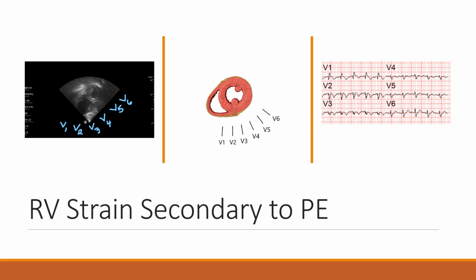And so you can see the left ventricle is definitely holding its shape. It's squeezing away, really, really compressing, and that's because it's not getting any blood. And it's not getting any blood because you can look at that right ventricle, and instead of looking like a croissant, it's really, really big. And it's really big because it's full of blood. And it's full of blood because it's trying to pump against a massive pulmonary embolism, and it can't. And it's actually squishing on the left ventricle and causing diastolic heart failure.